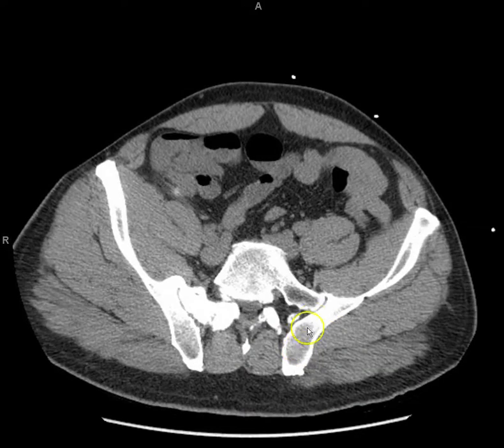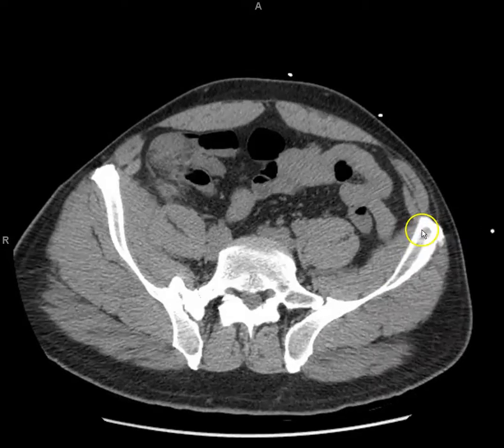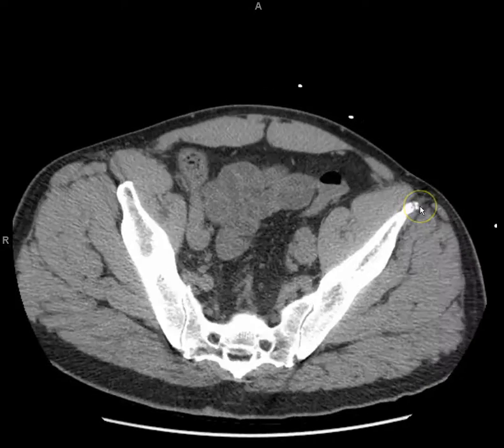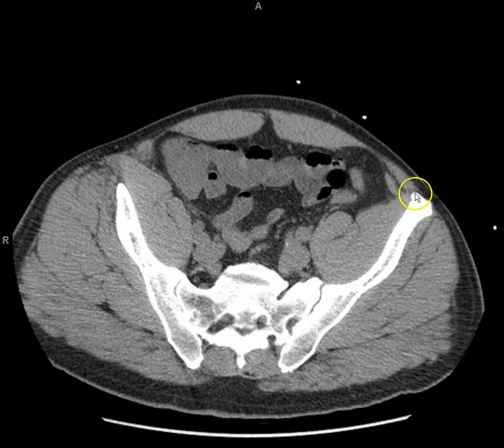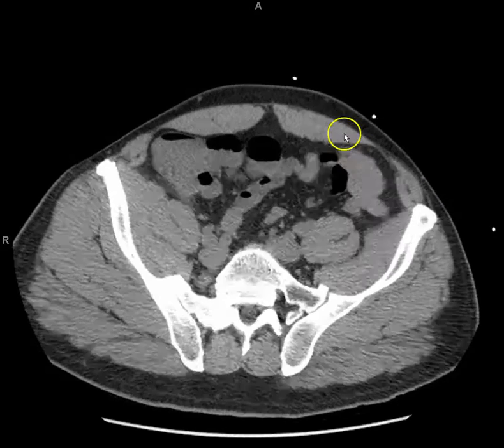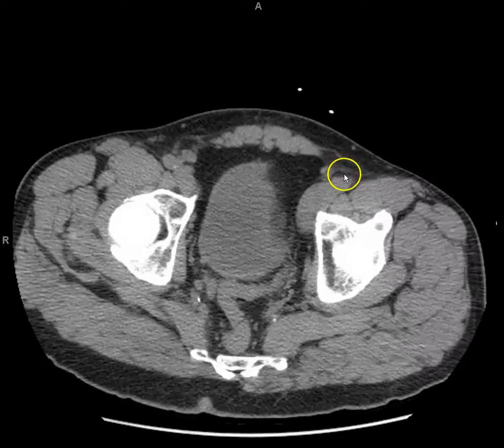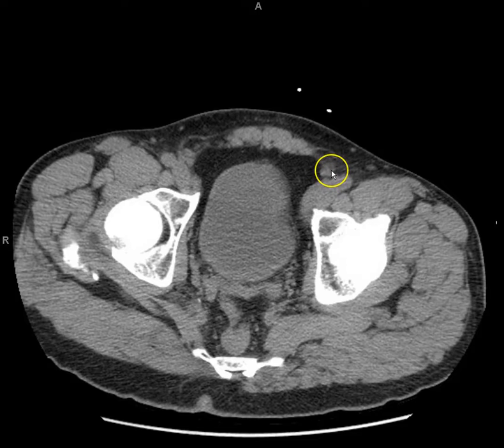Okay. So what is this? Ilium, right? And I'm sorry, I missed what the other two were. You said they weren't the rectal. What were they? Oh, I was showing you the inferior epigastric artery over here. Oh, okay. So that climbs back up. It comes off of the common femoral or iliac, right at the inguinal ligament, and it comes back up to meet the superior.